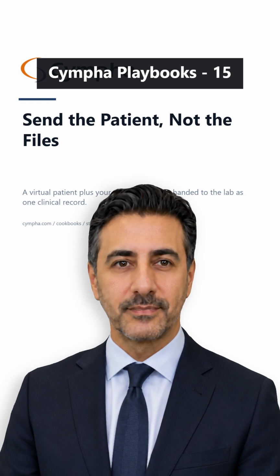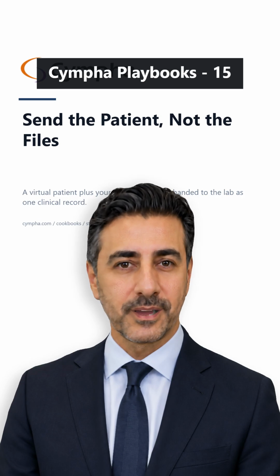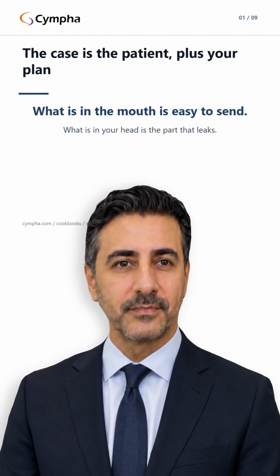Welcome to Guide Mia. Today we're going to talk about handing a case to your lab as a virtual patient in Cympha Studio. The hardest part of sending a case to your lab has never been the scanning. It is the translation. A dental case is what is in the patient's mouth, plus what is in your head about that patient. The tooth you mean to extract, the margin you would cut, the shadow you noticed on scan. Watch how Cympha lets both of those travel together.